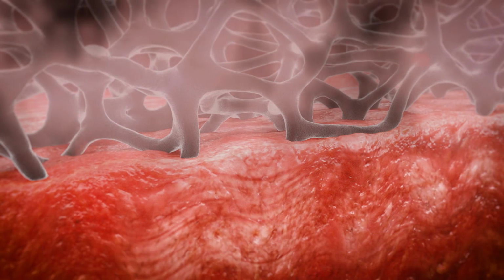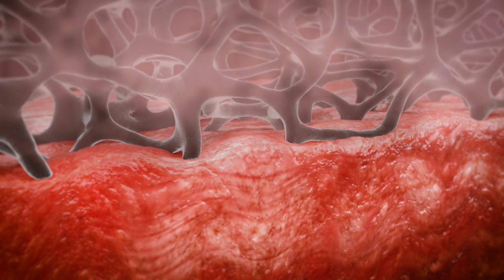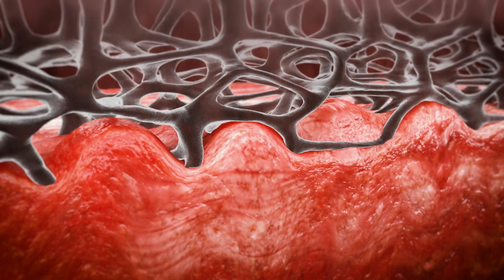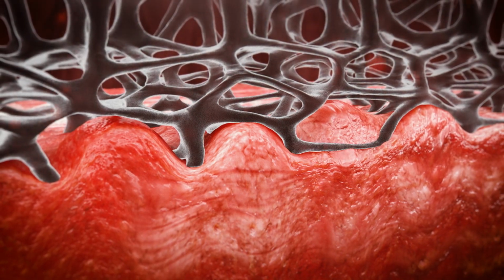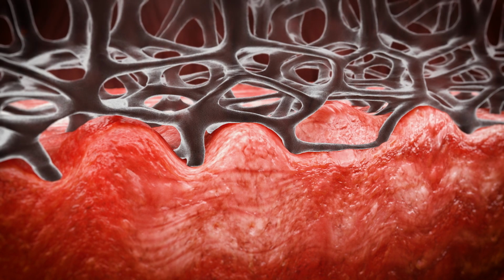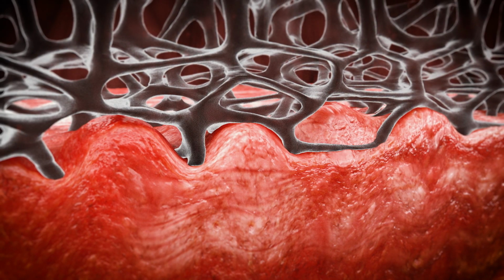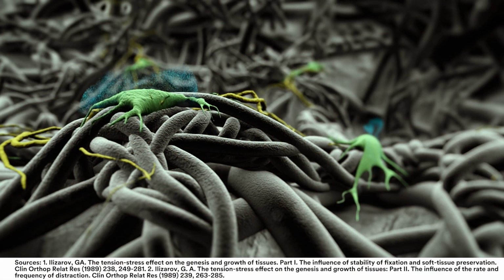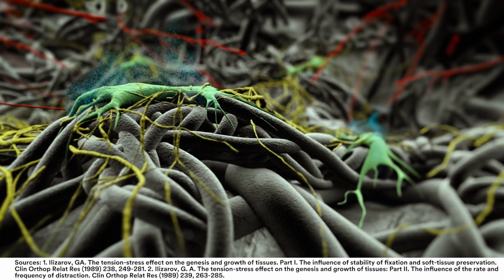The biological responses are initiated as an effect of microstrain, which results from the manifolding of negative pressure across the proprietary 3M VAC Granufoam dressing to the wound surface. This creates areas of cell surface strain, also called microdeformation. Tissue microdeformation at the cellular level leads to cell stretch. When cells of any kind are stretched, they are stimulated to expand, become thicker and more metabolically active.